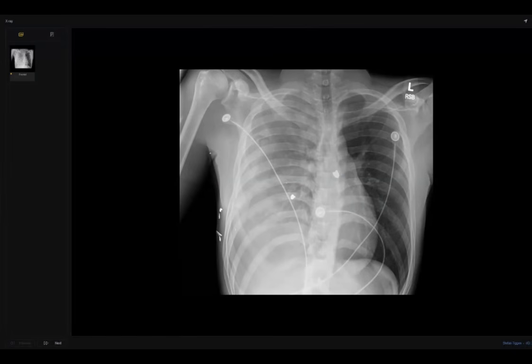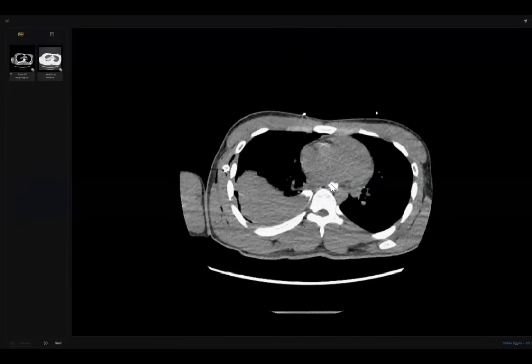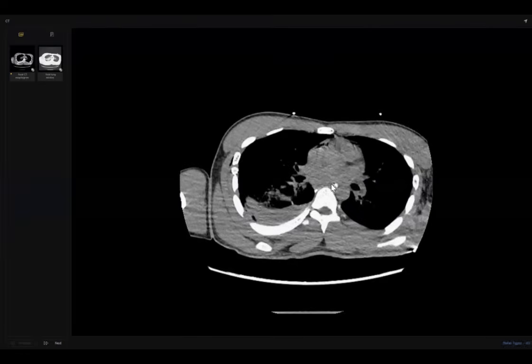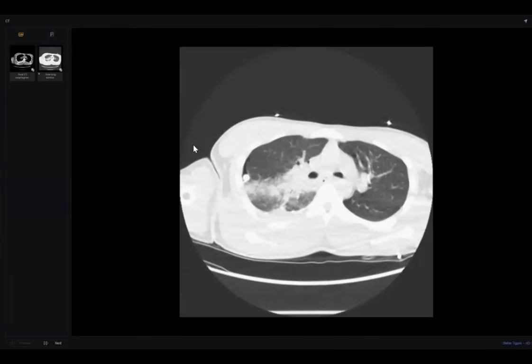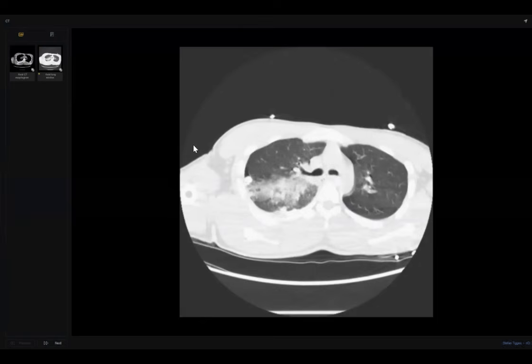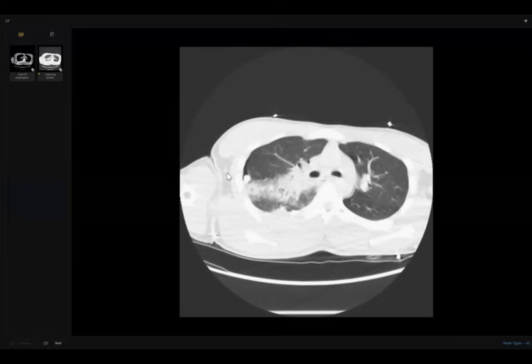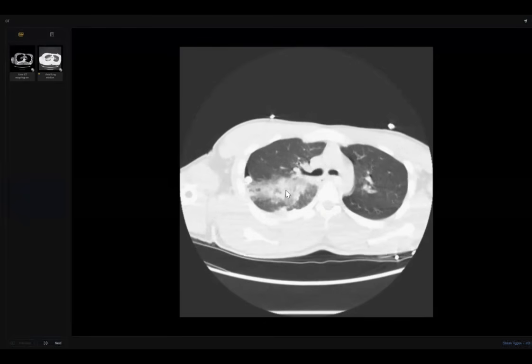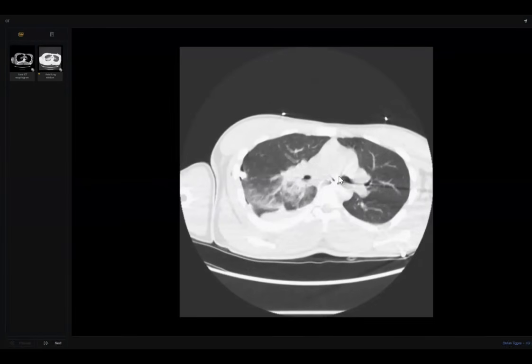So this case teaches us how to guess. Very important. Why? Foreign body here and contrast extravasation and the track. The examiner will not tell you some histories because if he told you, he would give you the answer. This is the short track. How could we know? It looks like contusion plus air, but it is a track. And if you follow it, you must find the foreign body, like here.